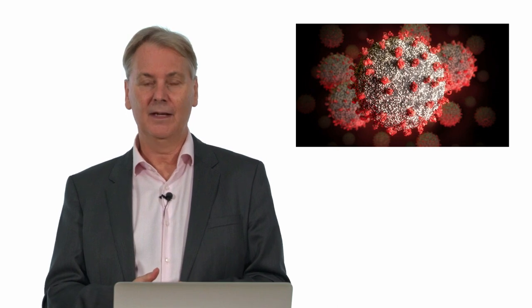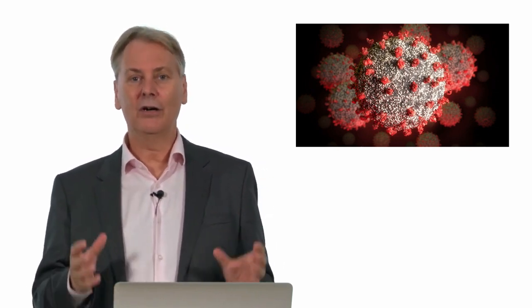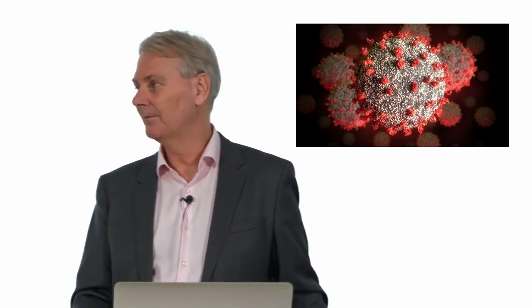If you follow the EFAS protocol, you're going to cover a lot of pathologies, but there is much more we can do with ultrasound. Maybe not part of the standard protocol, but even more important now in the situation we are in with COVID-19 infection. Let us show you some examples and discuss how ultrasound can be used in this setting.